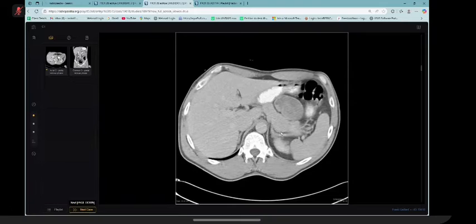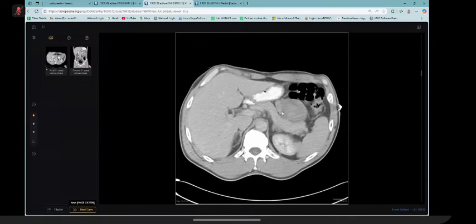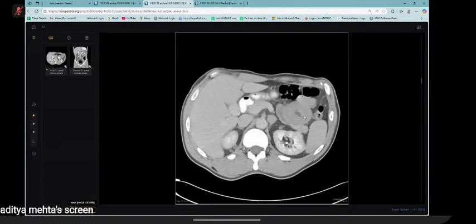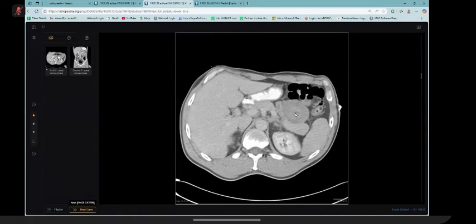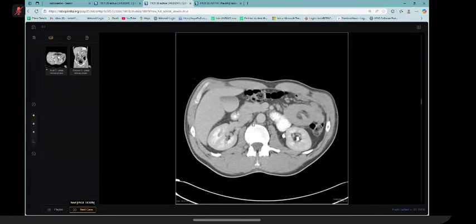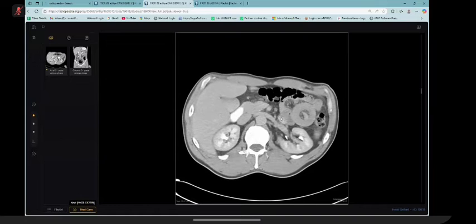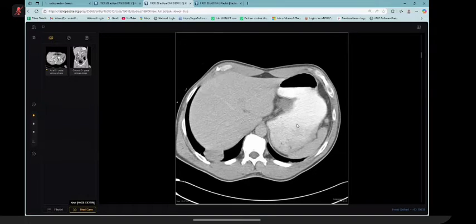However, confining to this case, as there is intussusception in the left side of the abdomen, likely jejunal, with thickening of the bowel and invagination of the mesentery showing lymph nodes. So the cause could be lymphoma causing intussusception with lung metastasis. There was a small non-enhancement of the bowel wall I was suspecting, so there could be some element of gangrene.